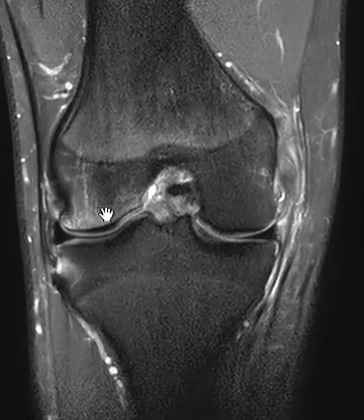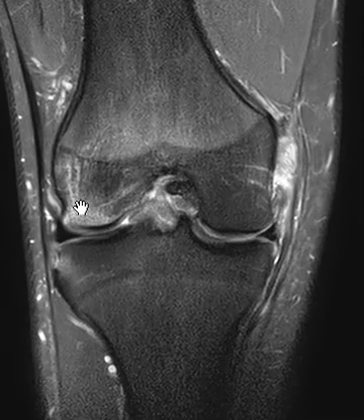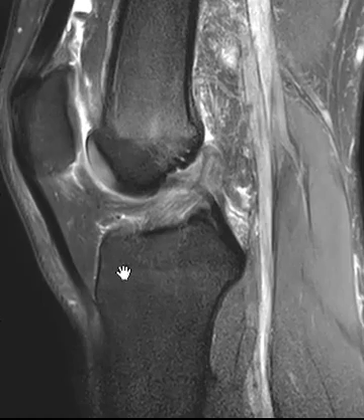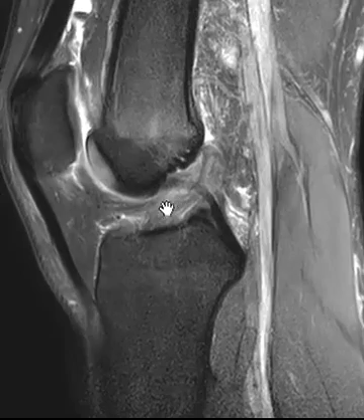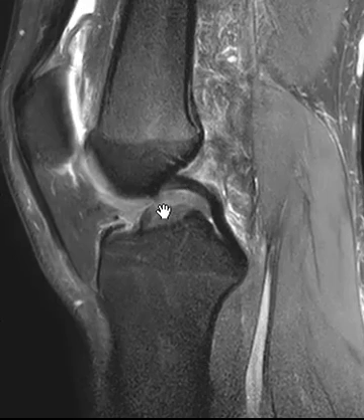Usually you don't see this with this injury, but medial collateral ligament tear, impaction injury means a valgus stress injury. A lot of times with those, again, you get the ACL tear, which we can appreciate here. This is the ACL. Instead of being nice and straight, it's thick and it's lax. It lays horizontally here.